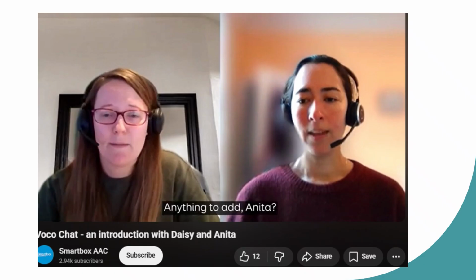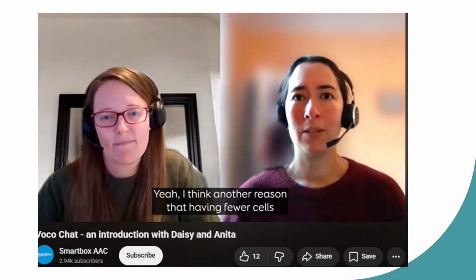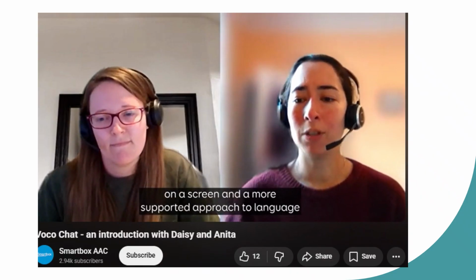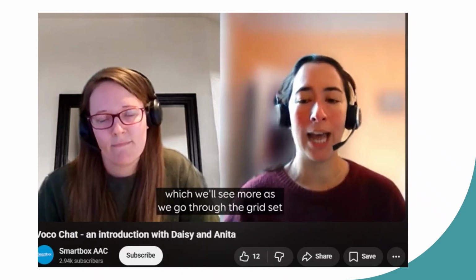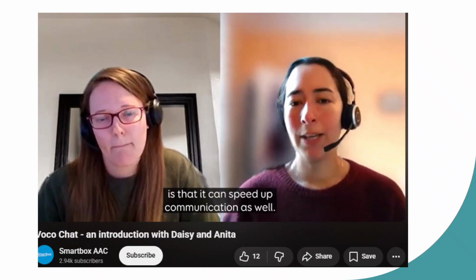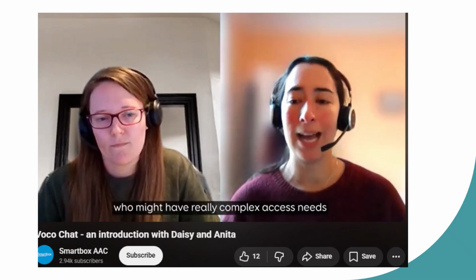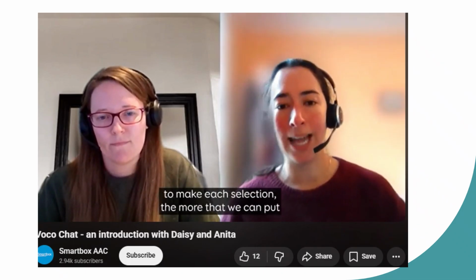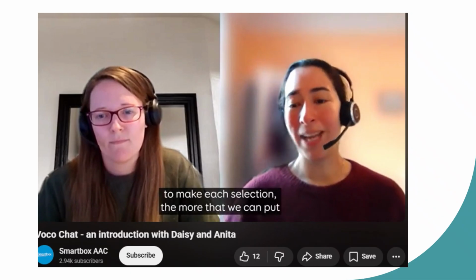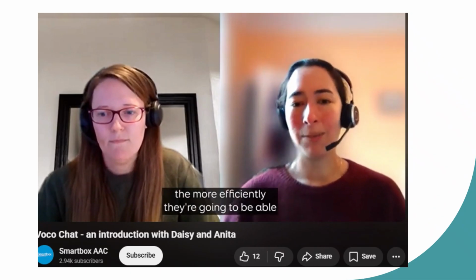Anything to add, Anita? Yeah, I think another reason that having fewer cells on a screen and a more supported approach to language, which we'll see more as we go through the grid set, is that it can speed up communication as well. So if you're thinking about someone who might have really complex access needs and it's going to take them quite a long time to make each selection, the more that we can put into each selection for that user, the more efficiently they're going to be able to communicate.